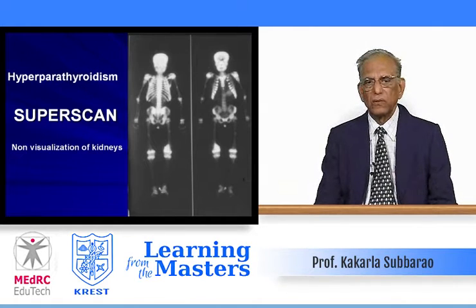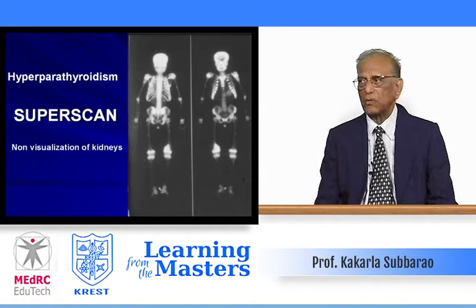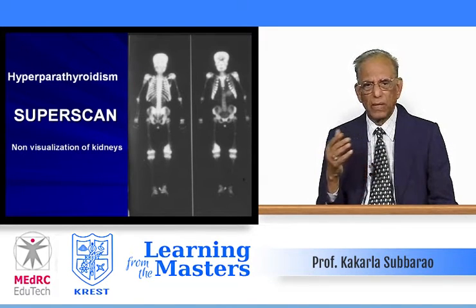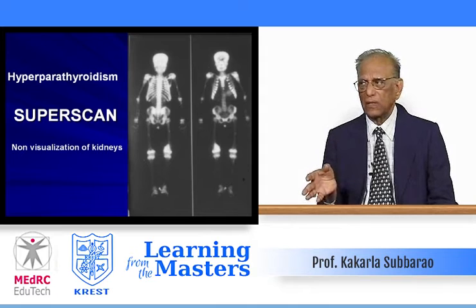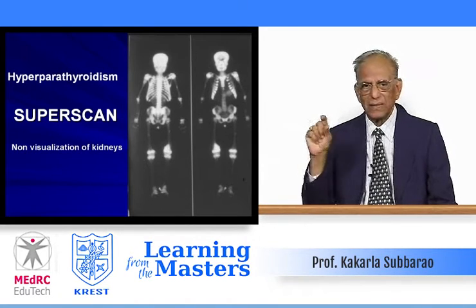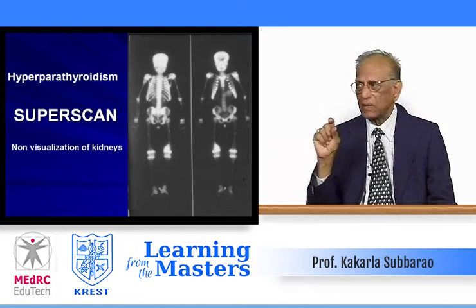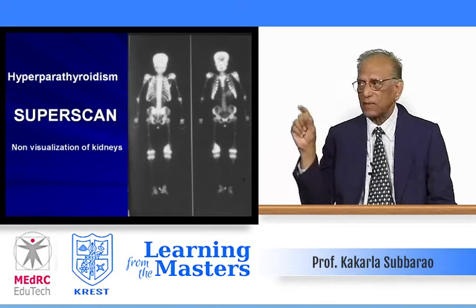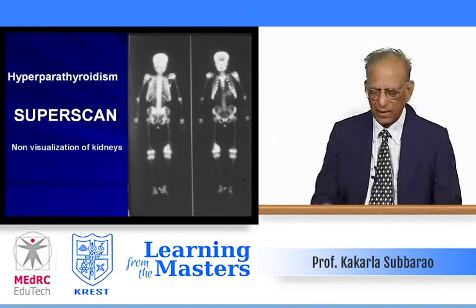In chronic renal failure, you can get what is called renal osteodystrophy syndrome. What are the 5 features? Osteoporosis, osteomalacia, osteosclerosis, soft tissue calcifications, including para-articular soft tissues, vascular calcifications, cartilage calcifications, and secondary hyperparathyroidism. Look at the rugger-jersey spine, classically described because of the dense articular bands with central lucency. That central lucency is just a normal bone, but it is exaggerated by the sclerotic bands on either side.